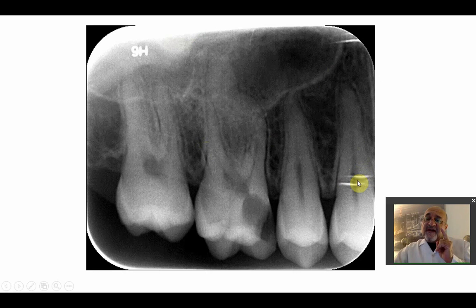These are scratches, as we said earlier, caused by overuse and scratching of the PSP plates. So if you have scratches like these, don't continue working on this plate, because it will block some of the important areas on your radiograph.